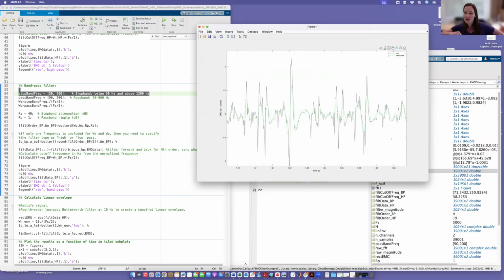The spikes are less sharp, right? And that's because of the band pass filter, right? So because we've put the filter for the higher frequencies too low, it's now attenuating that signal and getting rid of some signal that's actually the real physiological signal.